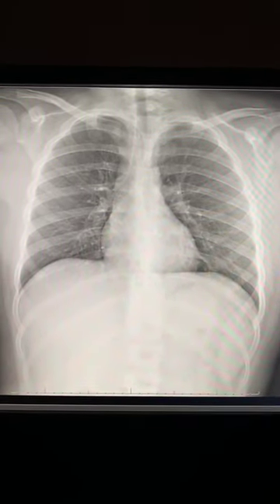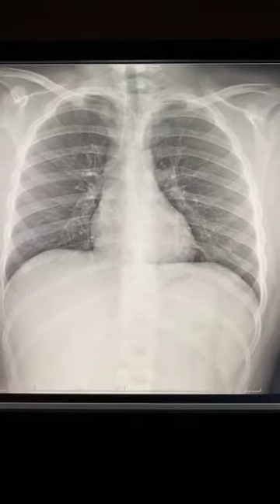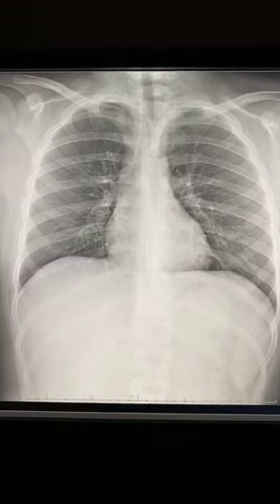All right, so we got a chest X-ray. It's a frontal and a lateral view right here. So L, left side. These are just from the tech who did that. All right, so here we go. I pull up the chest X-ray. I look at the indication. It's toe pain. I'm not joking you.